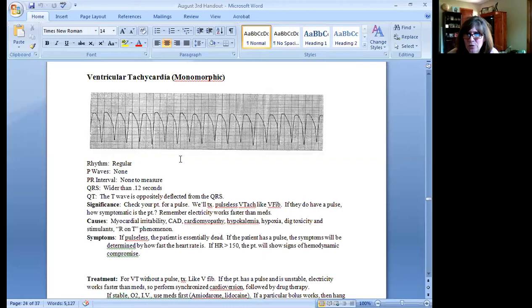Systematic overview. Well, where do I count it from, Ms. Garrettson? I always like to count it from the point. That point might be upright or downward, but here it's downwardly deflected. So 1, 2, 3, 4, 5, 6, 7, 8, 9, 10, 11, 12, 13, 14, 15, 16, 17, 18. That rate's 180. That's pretty fast.